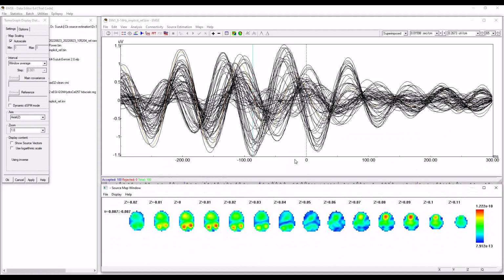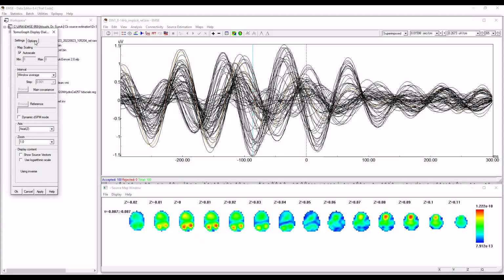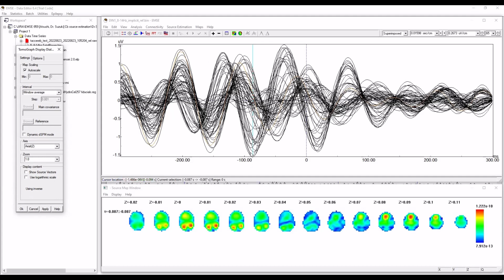And here we are. Now already we can see something here that looks promising, possibly cerebellum. This, by the way, is the average over this entire time interval. But already we can see something here that looks like it might be cerebellum. Let's select. Oh, actually, it might be this selection at this time range because I already had selected that.